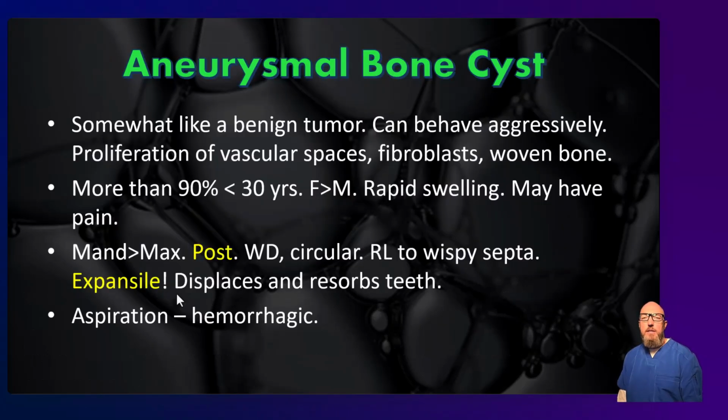So that pretty much does it for the MACHO acronym. You'll notice I didn't talk about the O. The O is for OKC, because we talked about that with the unilocular lesions. Just know that it can appear multilocular. Sometimes it appears similar to an ameloblastoma, but if you have that true round soap bubble, small loculations, that's not so much your OKC. And I did kind of talk about how to differentiate the two. OKC expands more along the bone without really widening buccal or lingually or supra-inferiorly. So pay attention to that expansion pattern, and hopefully you'll be able to identify OKC versus ameloblastoma.